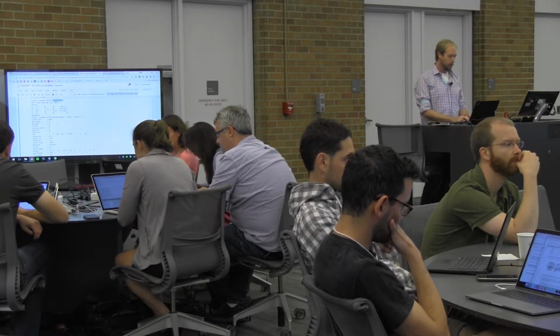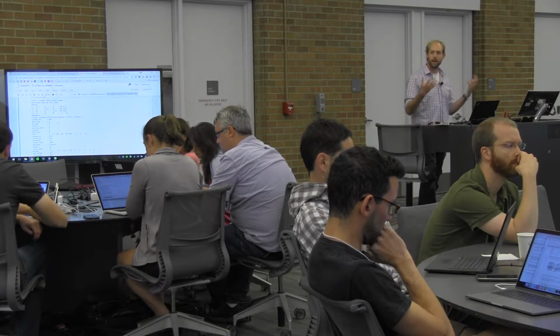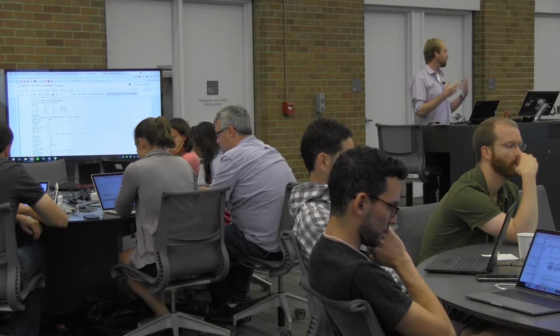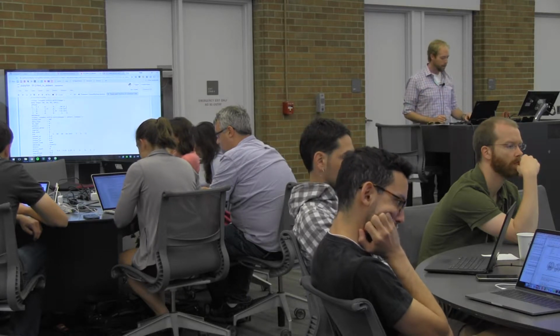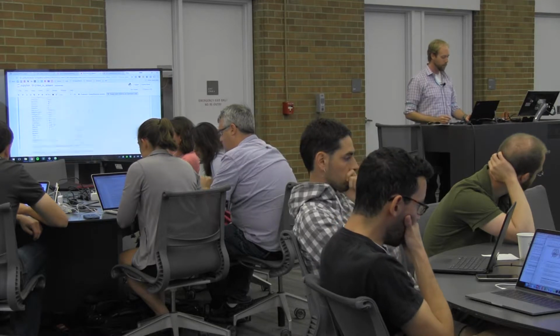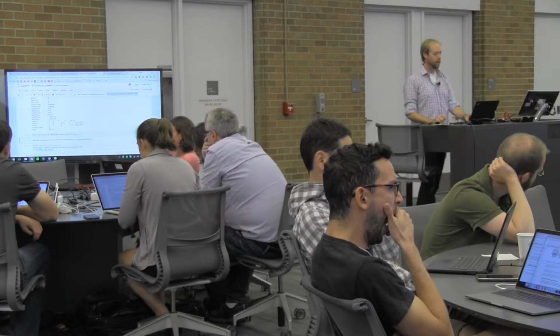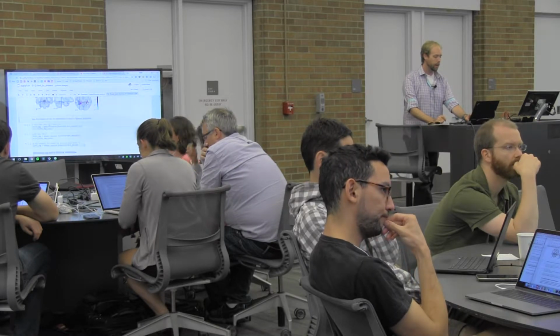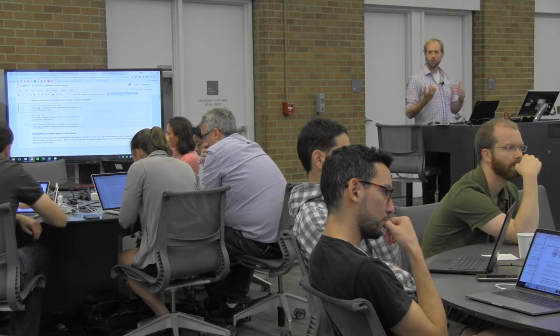Yeah. And so inside of that Nifti Masker object is a bunch of metadata about the shape of the original data and probably a bit of information that was inside the header, stuff like that. And so using this, we can just return back the results as a Nifti object itself. And then we can do things like plot statistical maps of that Nifti object. We can also save it to disk, which I'll show in the next notebook.